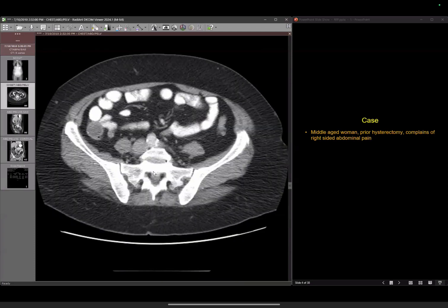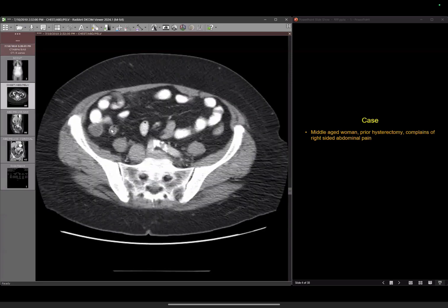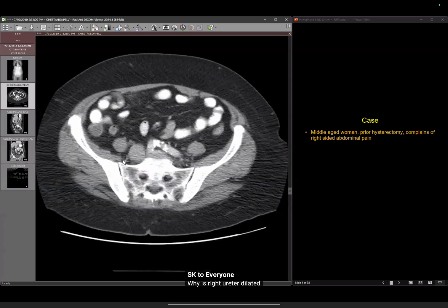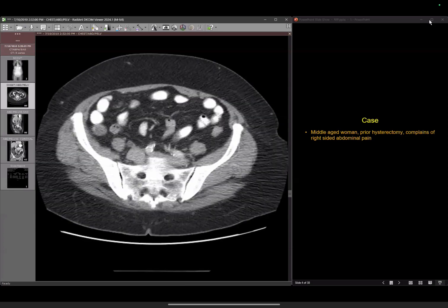Yes, sir. You are absolutely correct. There is a fluid-filled appendix, no surrounding stranding, with peripheral calcification at the edge. My question is, are you going to call this mucocele and that's it? Or appendiceal neoplasms. Low-grade appendiceal neoplasms, we will do that.